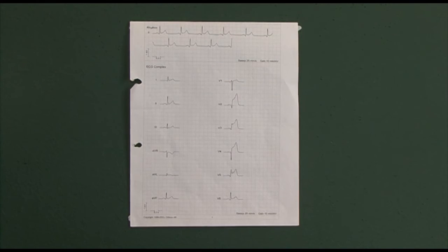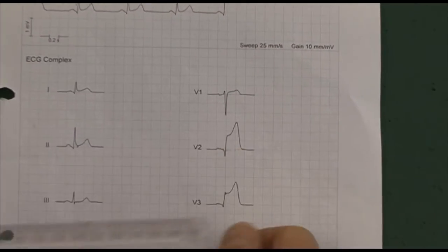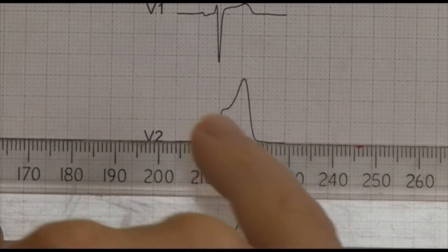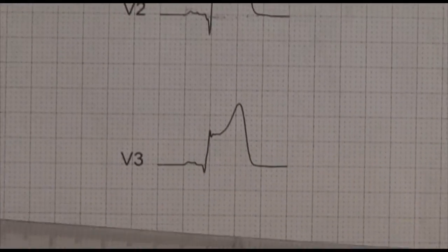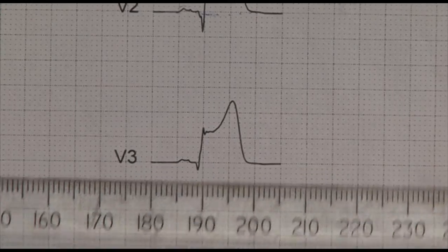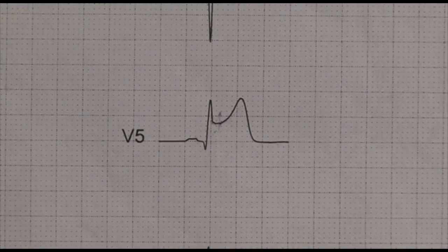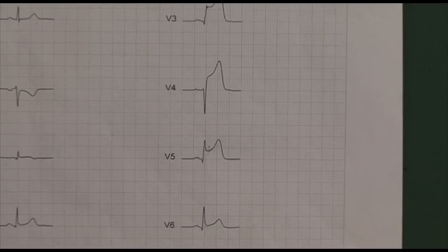Well, on this one we notice that there's ST elevation here. There's the baseline, very obvious and pronounced ST elevation on V2 and on V3, on V4 and V5. This is an obvious ST elevation myocardial infarction.